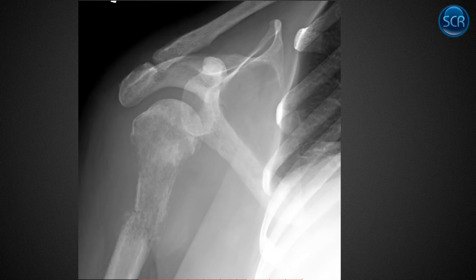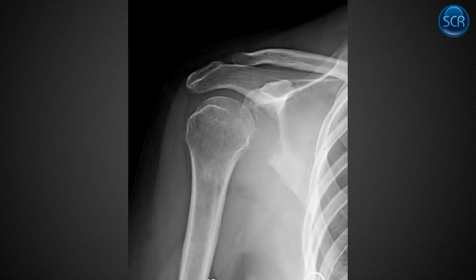Could this be lymphoma or even multiple myeloma? It's possible. With multiple myeloma, we usually expect to see some degree of punched out lesions, those types of things in classic cases. But there's a wide differential here. But almost certainly this is a metastatic lesion, and that's what it turned out to be. Here's another example of metastatic lesion. This one was a renal cell carcinoma here to the glenoid.